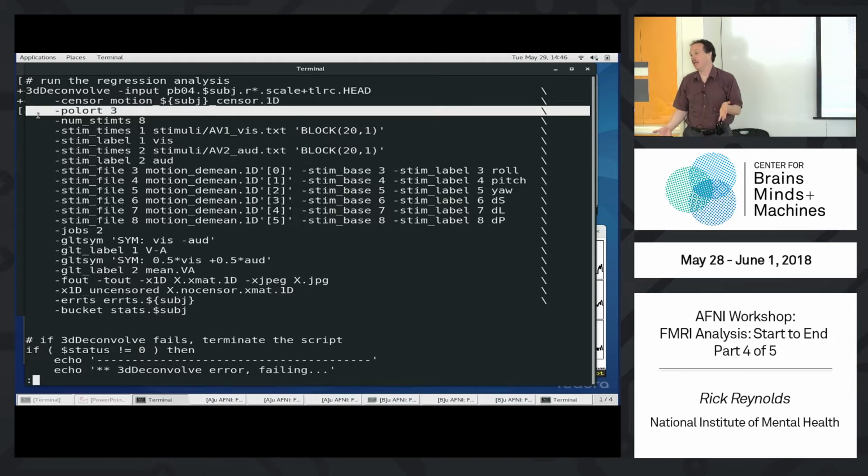It's going to be based on that, but you really have to think about it. If you have a lot of classes with not so many events, and you lose a big fraction of your classes of interest, then you have to worry about it. In the end, when we run that SS Review Basic, the actual processing showed that at the end, and we'll look at it again. That tells you the fraction of non-zero time series values out of your regressors of interest, the fraction that was censored per class, or per regressor actually. So it'll tell you you lost 30% of this regressor of interest. And if that's too much, then you drop it.